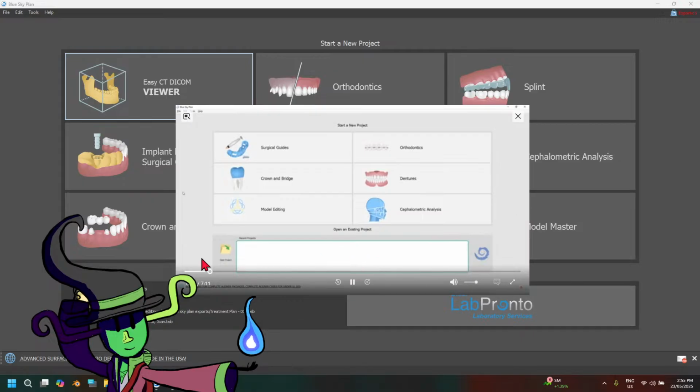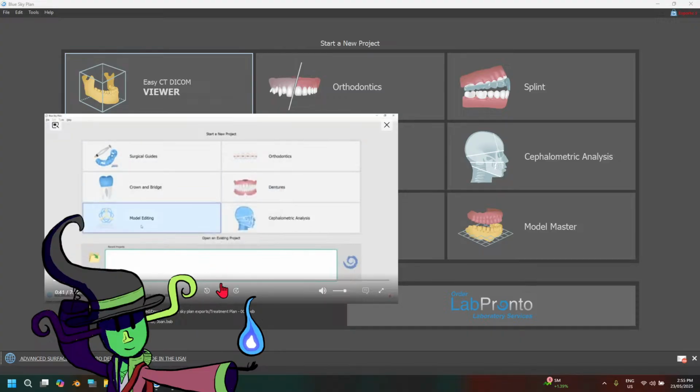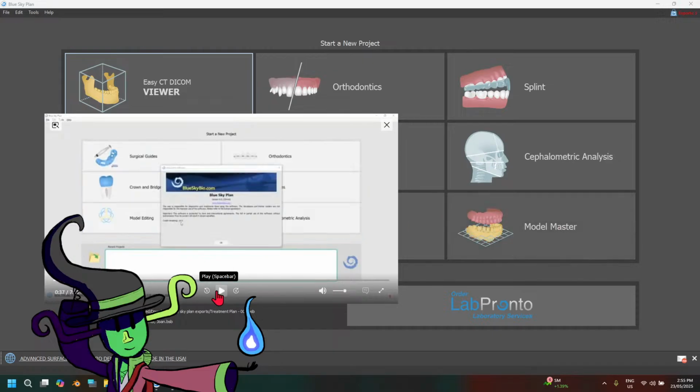So check that out via the link here. And I'm going to show how the process can be done at no cost. So we have 14.5 credits remaining right now. Let's check this out. Dang, this guy's rolling in dough. 14.5 credits. What are you doing?